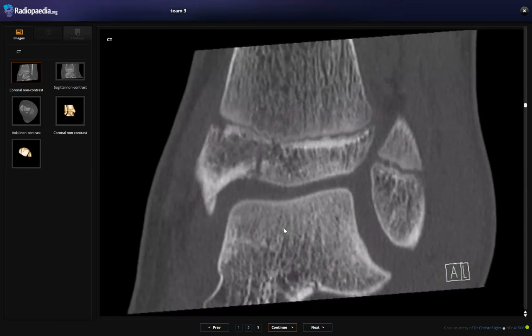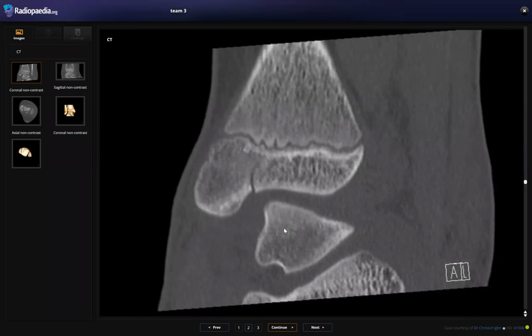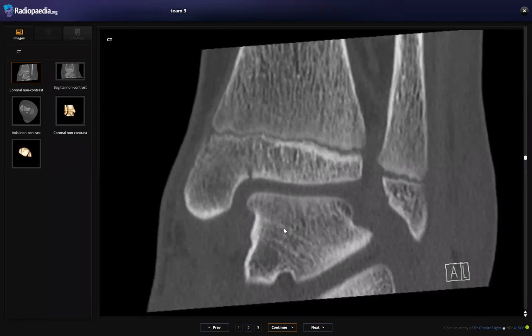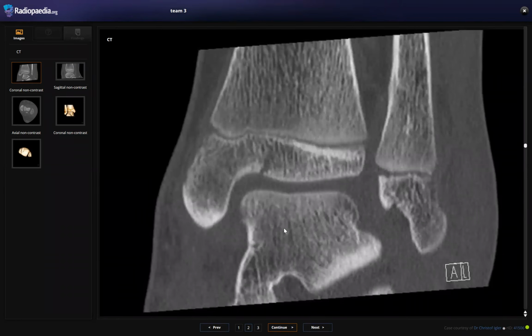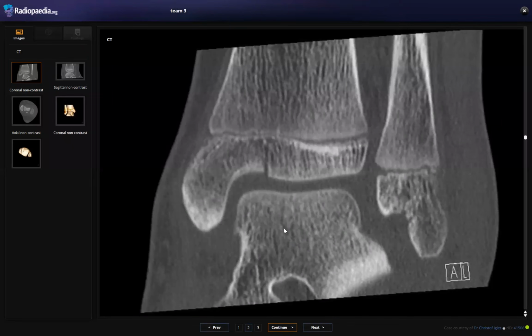I'm looking for the metaphyseal injury, which I'm unable to appreciate. So this is the vertical fracture along the epiphysis and the horizontal fracture along the growth plate. So it's the triplane fracture. Okay. And that is, oh, Salter Harris type 3. Exactly. Yes.